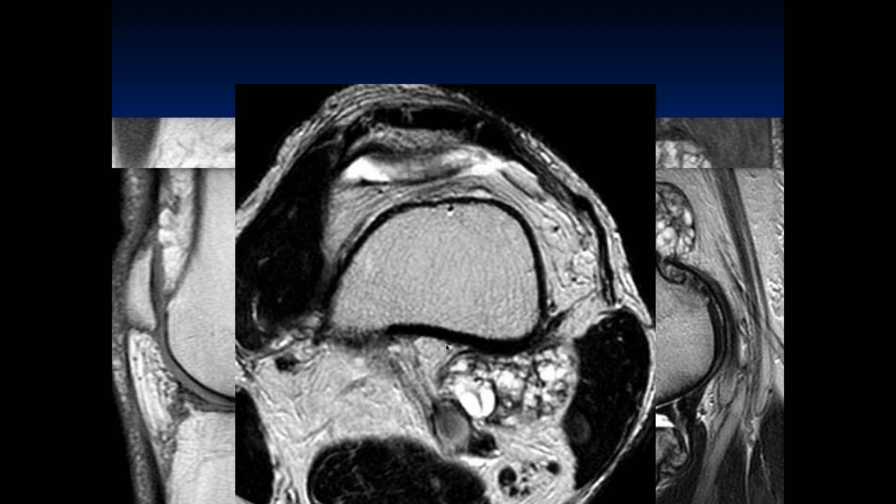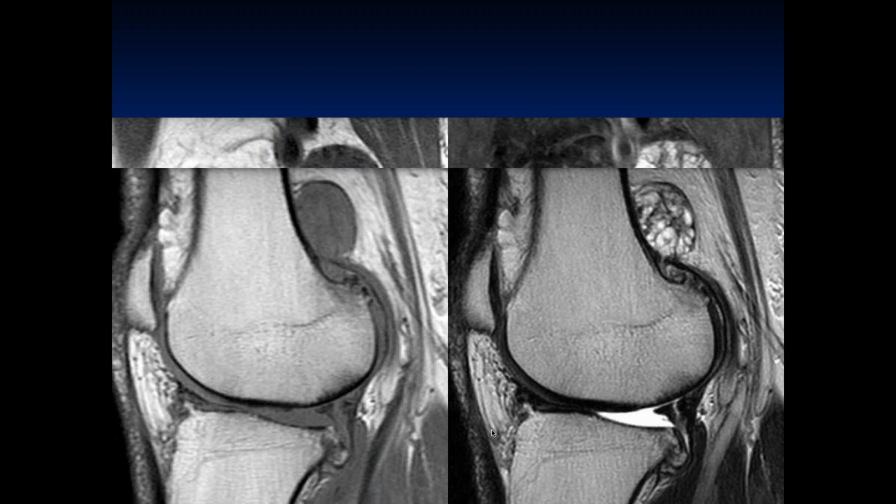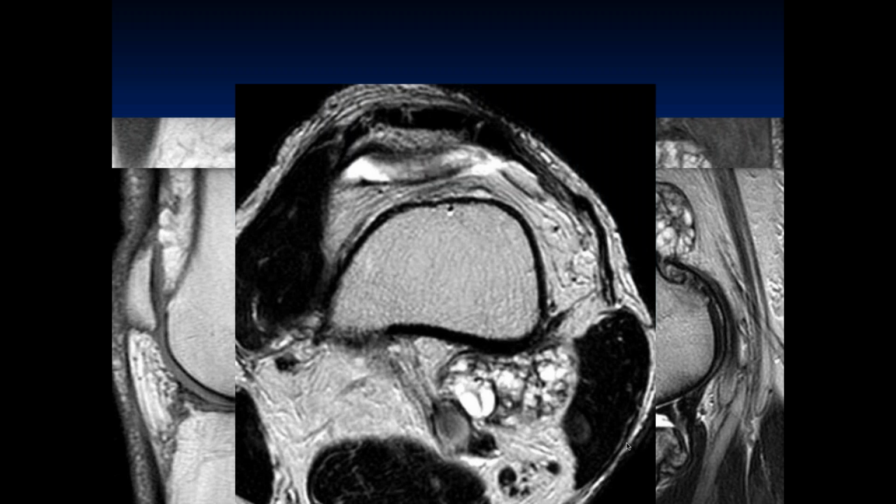John, do you think there is a connection between that cyst and the joint? I have a feeling that there is. Yeah, I've always thought that there is. I think there probably is. Sometimes you can actually see fluid going up and tracking into it, but not always. But I agree with you. I think it probably does communicate with the joint space. Yeah, if you look at the knee joint, it's not exactly normal. No, you've got grade 4 chondromalacia here, with remodeling in that lateral compartment.